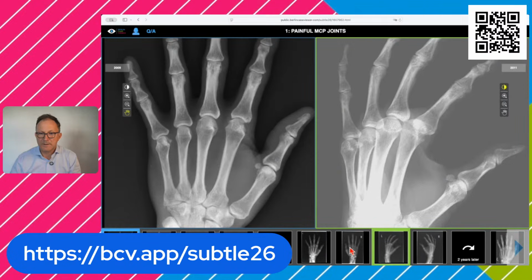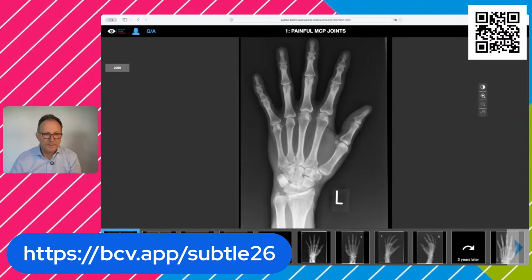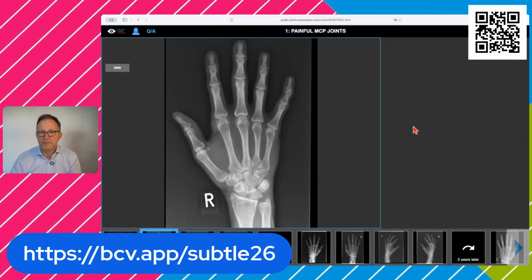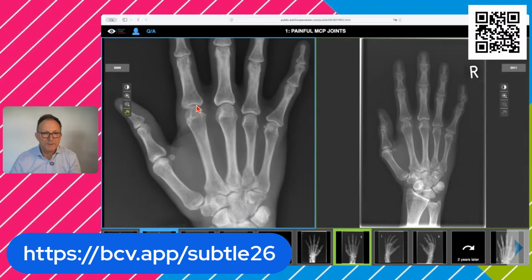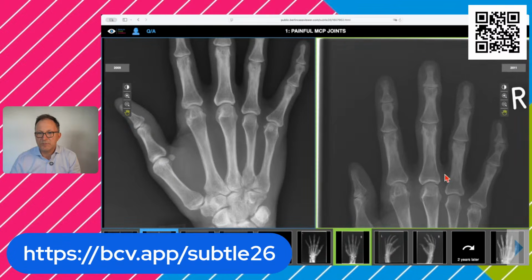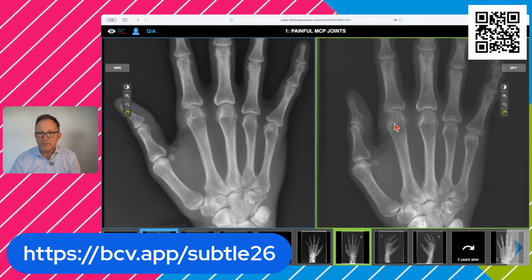Looking at the right side, I think I need to refresh this one. Looking at the right hand, we can see that the subtle cystic changes here and the subtle joint space narrowing, also the soft tissue swelling, has now progressed to more pronounced destruction in the bone.